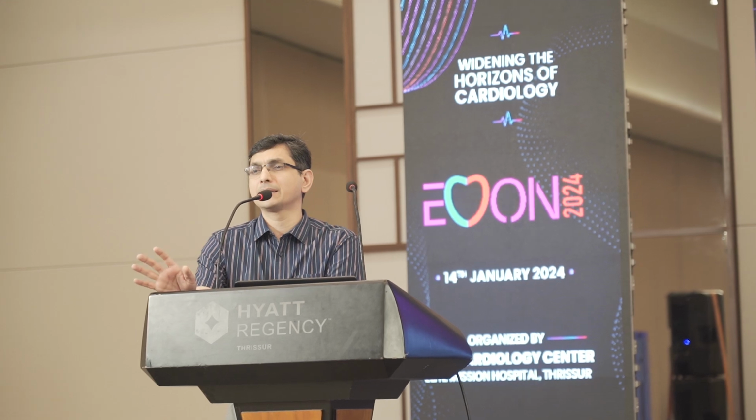For assessing viability, you have nuclear SPECT as well as MRI. So which one do you prefer? There are studies that show that if we are doing viability by nuclear SPECT, it will detect only the number of viable cells. Those cells may be at two different points, some at the endocardium, others at the epicardium, but to detect the extent of infarct and the rest of the viable tissue, cardiac MRI may be useful.